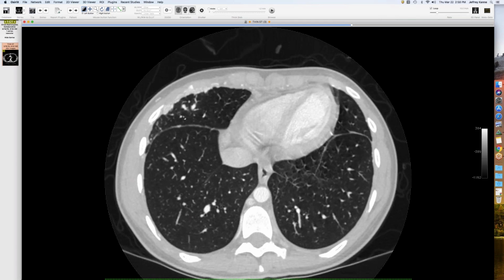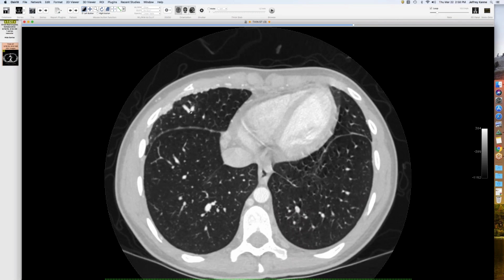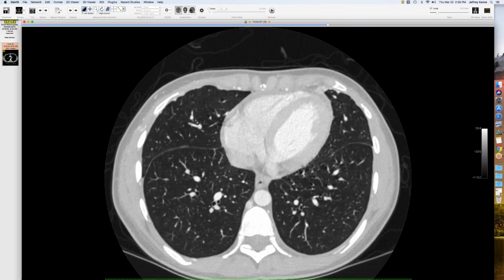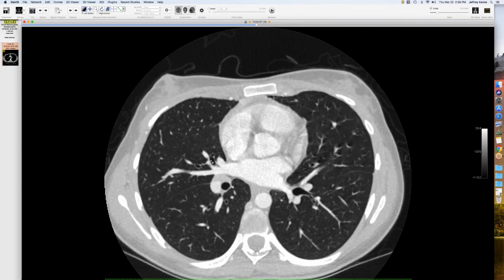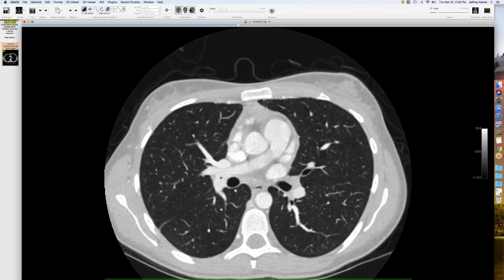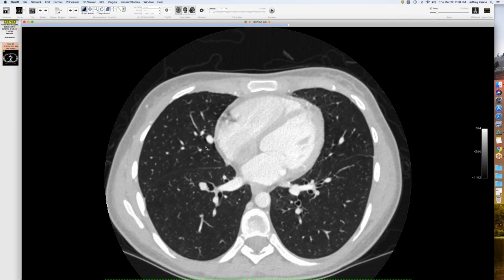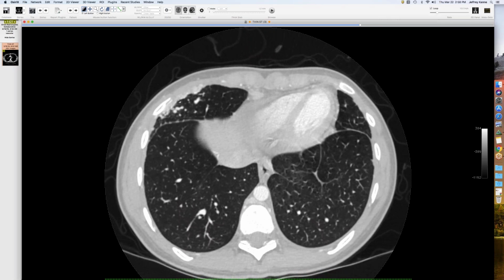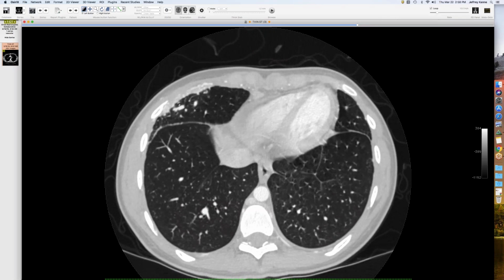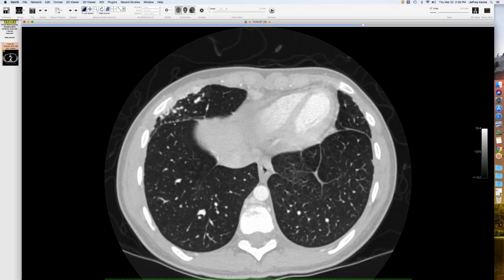And what's kind of cool is they anastomose into this middle lobe through all these tortuous vessels and then follow this large vessel back all the way here to the hilum, and it is coming off the right middle lobe pulmonary artery. So it looks like it's a systemic to pulmonary arterial shunt, because to me this looks like mostly systemic arteries coming back. And if you look along the fissure, you see how thickened and nodular it is. I think those are all vessels running along the pleural surface.